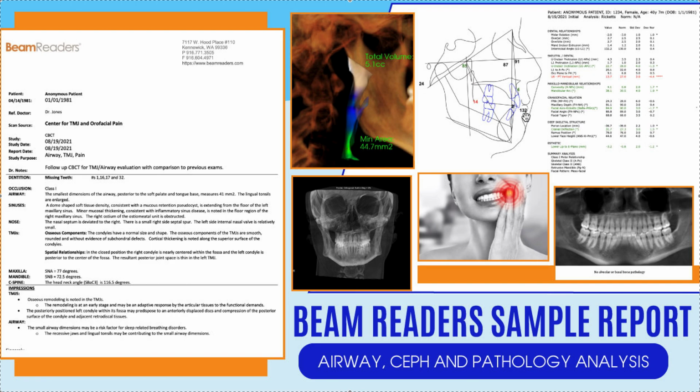So obviously they took the giant CBCT 3D and they took a Ceph slice out of it and they gave a nice Ceph report, which is great. It's Ricketts, but I'm assuming you can pick a different one. I'm not a huge Ricketts fan, just not the way I was trained. I prefer Steiner, but I'm sure that there's a way you can control that.